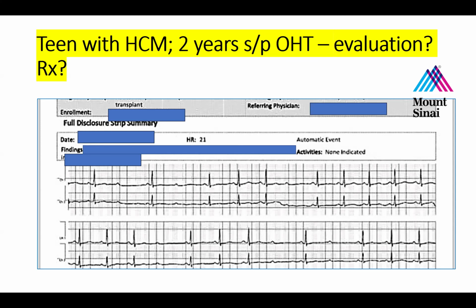So how would you describe this heart block? I'll give you choices: first degree, third degree, second degree, and then within second you have Mobitz 1 and Mobitz 2. So what do you think we got here? Is it first degree? Oh, sorry, I was muted. Sure. So I would say it's second degree heart block.